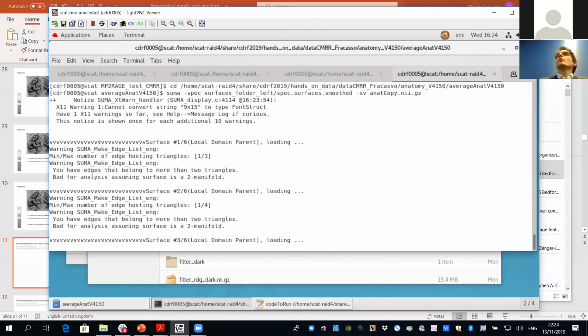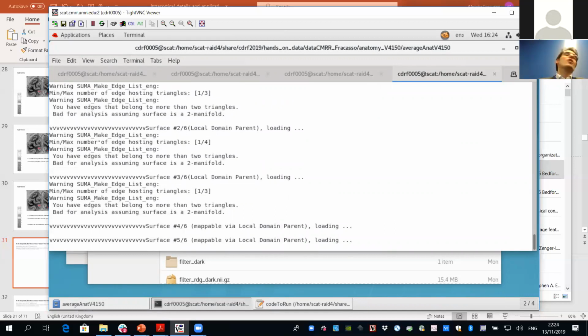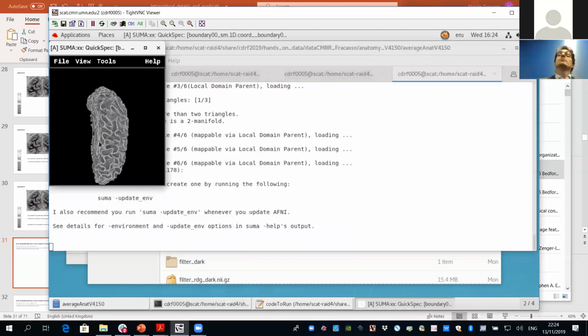And what I want to show you is the same thing, but here it is high resolution, and at least to my eyes, there's going to be less of a leakage of curvature information into the map.